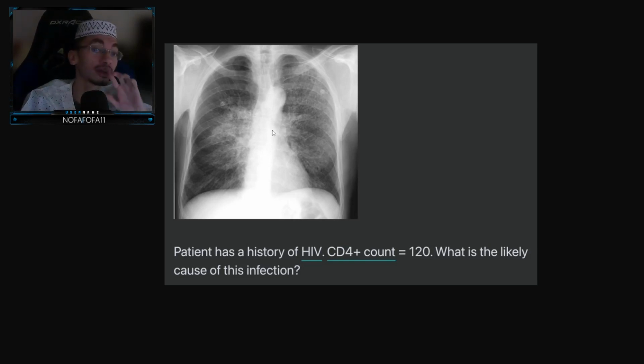Now when I look at the lungs themselves, the black fields, the interstitium, which is what composes the lungs, I notice an abnormality here in the central structure. I notice further widening, or enhancement, of the lungs' interstitium, and I'll tell you shortly what I mean by that.